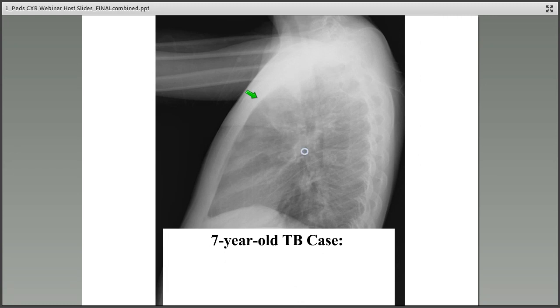On the lateral, remember this is the right upper bronchus. Anteriorly, you have increased size of the right pulmonary artery region, as well as in the left pulmonary artery extending inferiorly. This area is consistent with right hilar adenopathy seen on the frontal chest radiograph.